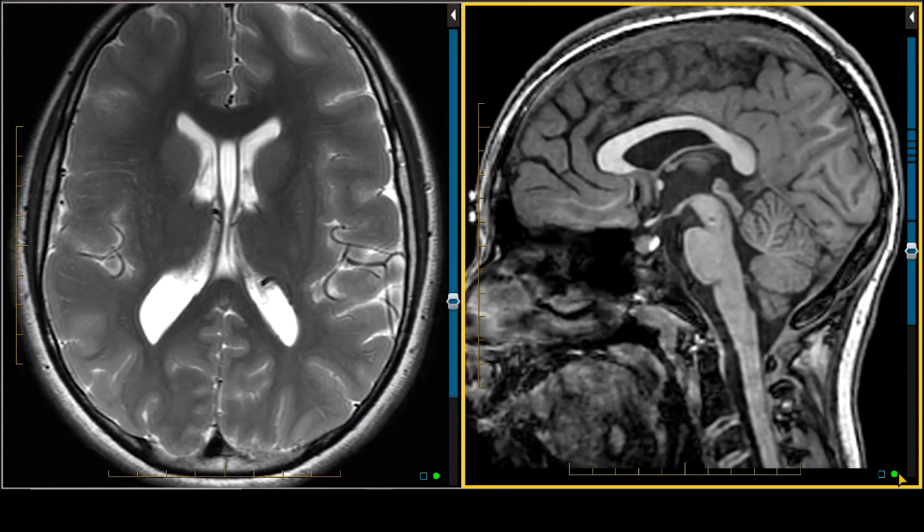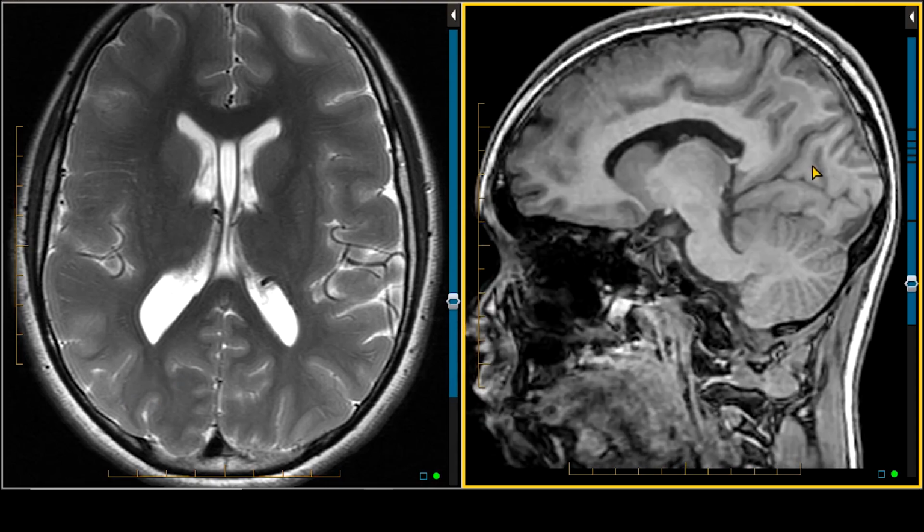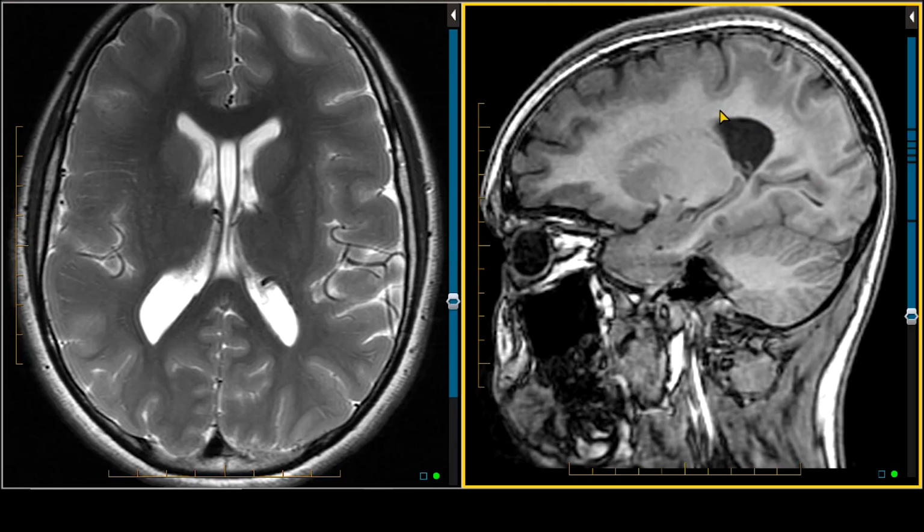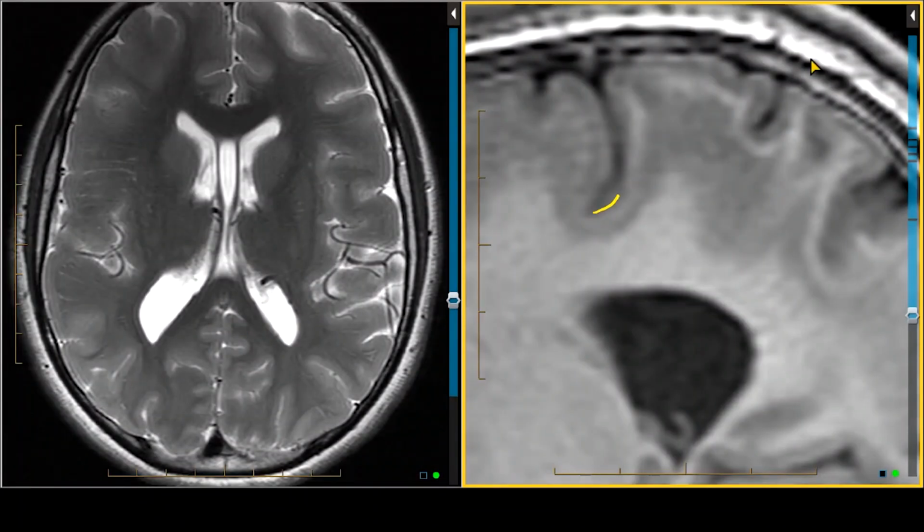This is an MRI of the brain in a child with developmental delay. And if we look on the T2-weighted imaging, we're seeing ill-defined gray-white differentiation posteriorly in the occipital lobes. If I go to the sagittal T1-weighted image, I actually get a little better delineation. I see the cortex at the periphery. Intervening is an area of white matter.